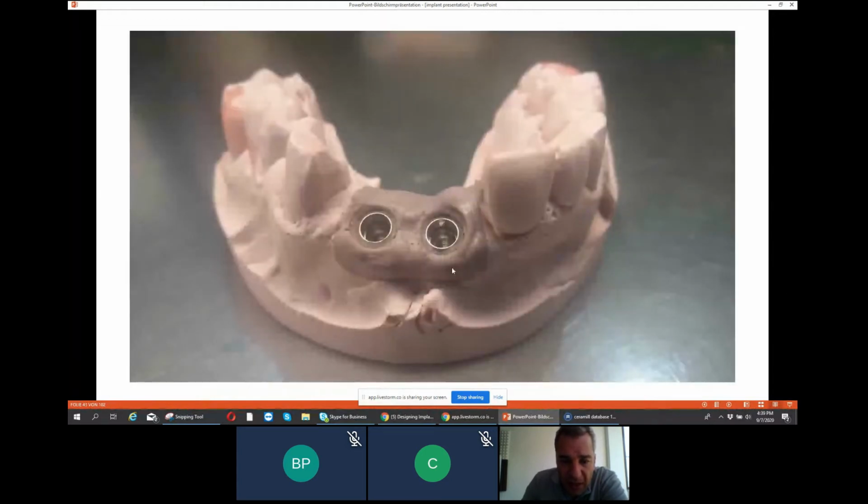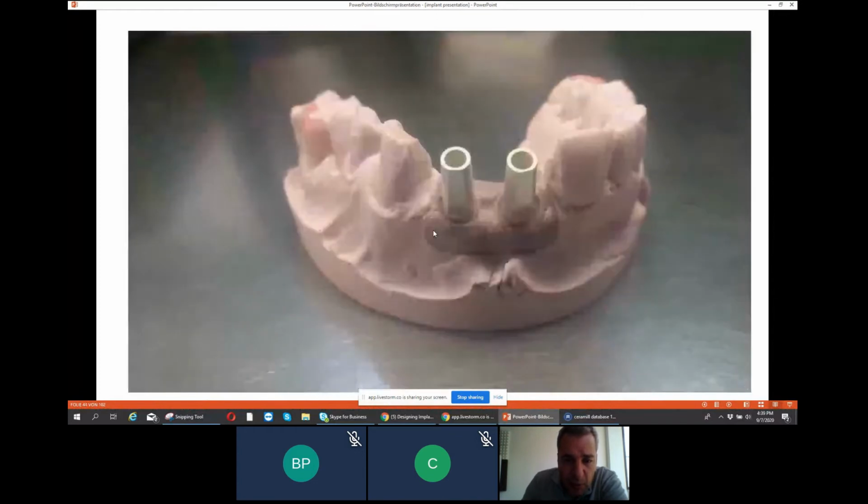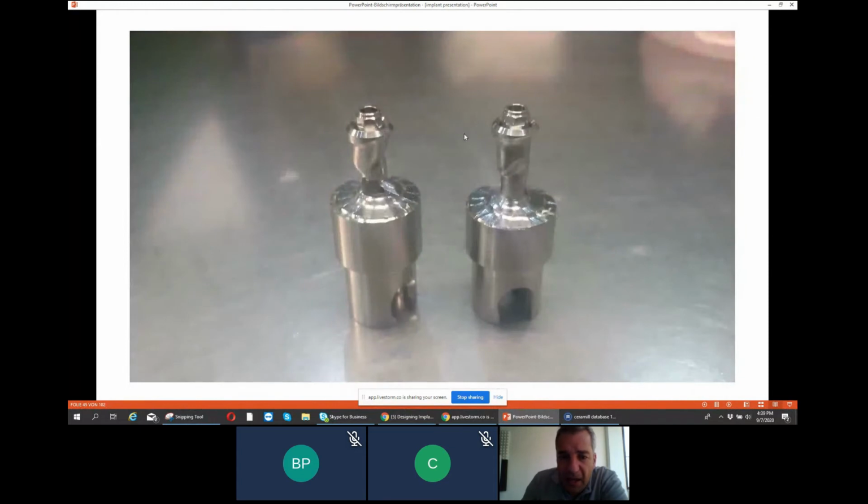The workflow, as you can see here: we have the tip of the implants. We will use the TiConnect scan body because we have a single restoration. Then we create our separate abutments. If you want to work with this type of abutments, I prefer that when you place it, you cut it, you fix your abutment, and then you rescan again to make the final restoration.